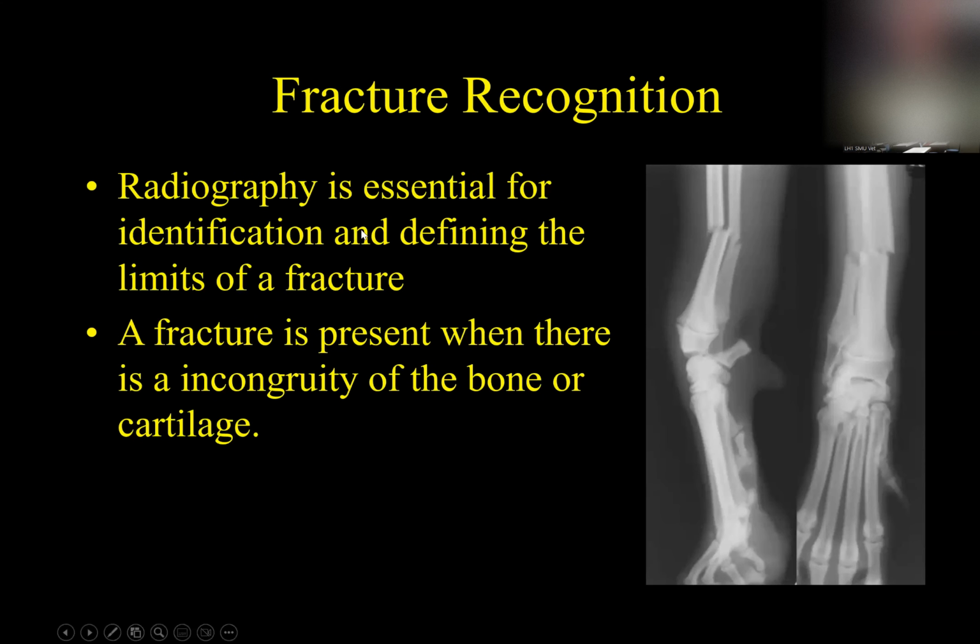Okay, so here I have an example of fracture. Obviously, there's a fracture here in the distal aspect of the radius, in the diaphyseal portion of the radius, and one of the adjacent ulna. Okay, I can see the fracture here as well. Over here, there's the radius, and there's the ulna.